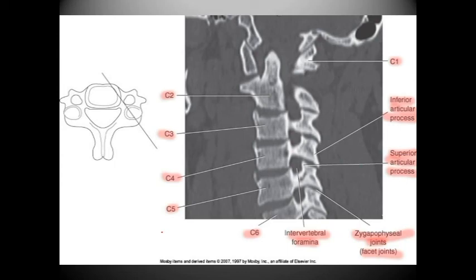So that brings us to what it looks like on CT. If we go by what we're seeing here, this is an oblique type of image. As we are running in an oblique plane through this, we're not running coronal or axial or even sagittal. The reason that we can say this is because we see the intervertebral foramen, and we do see the zygapophyseal joints. And so, because we can see the intervertebral foramen, we can assume that this is oblique.